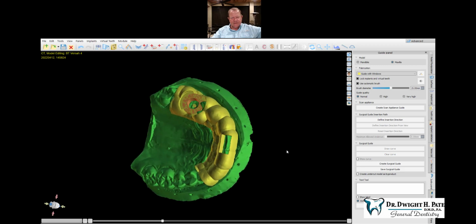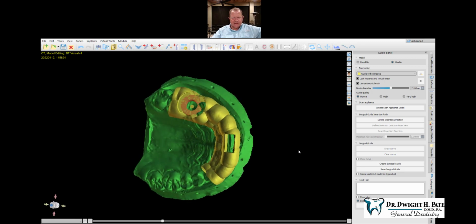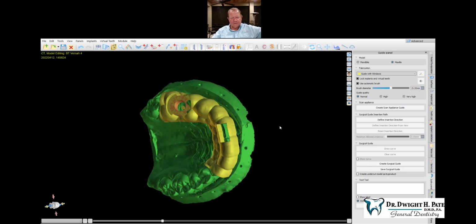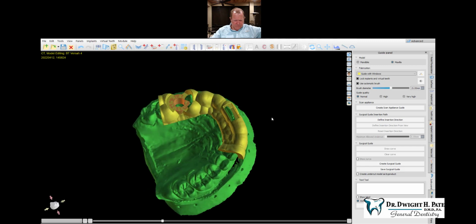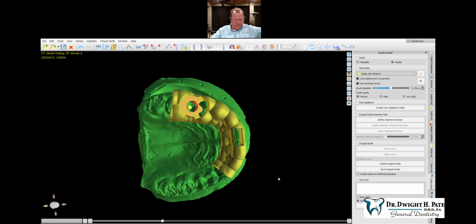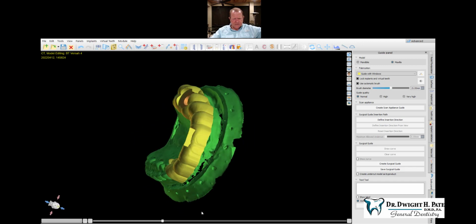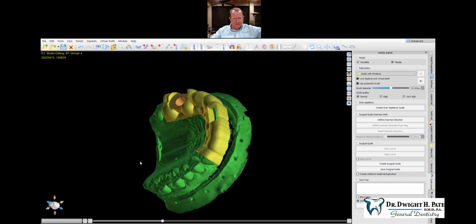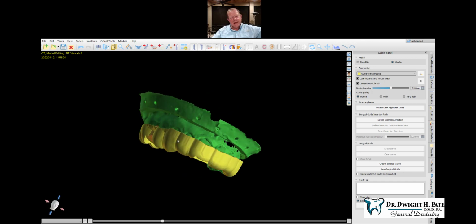Blue Sky will then eventually give you this file that you can work with. All right. You can label this. They have a label creator. Lots of different things you can do with it. But essentially, this is ready to be exported.